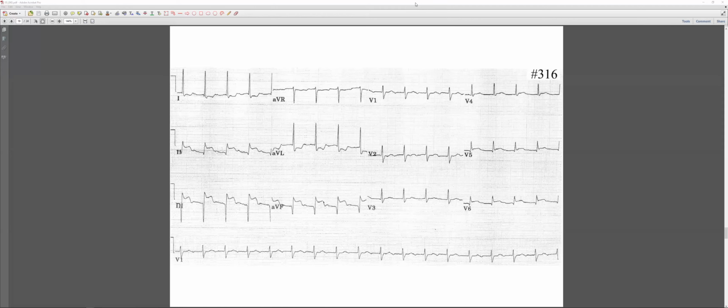Now I give you, okay. I'm sharing, and you be the last one and the best one for sure. Hope so. Me too. Okay, well, then the cursor is yours. Maybe I can magnify it a little bit.